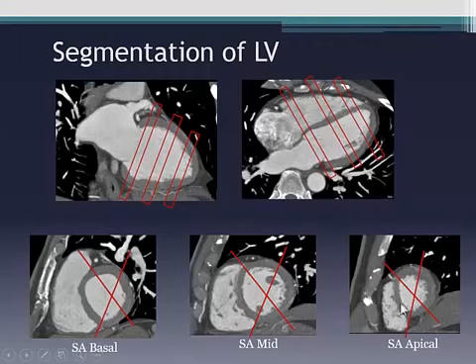A lot of your cardiology colleagues will say, show me the posterior wall, and that's what they mean. On MRI, echo, and even CT, when you're looking at these walls to assess viability, it's often helpful to cross-cut these to get a true long axis. You get a two-chamber cutting through like that. The four-chamber cuts through the anterolateral and the inferoseptum wall. The three-chamber goes through the anteroseptum and the inferolateral or posterior wall. So the three-chamber gives you the posterior wall and anteroseptum. The four-chamber gives you anterolateral and inferoseptum. The two-chamber gives you the anterior and the inferior wall. It's all to help you report based on the 17-segment model.